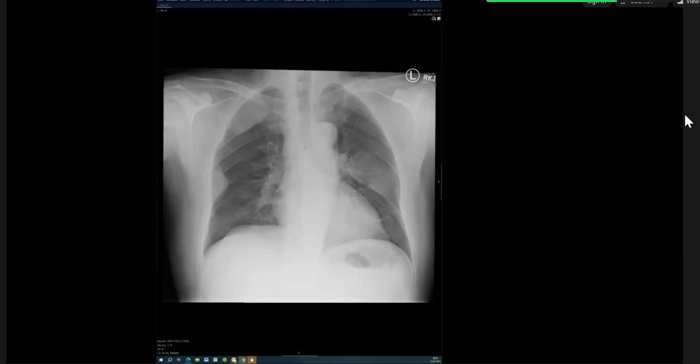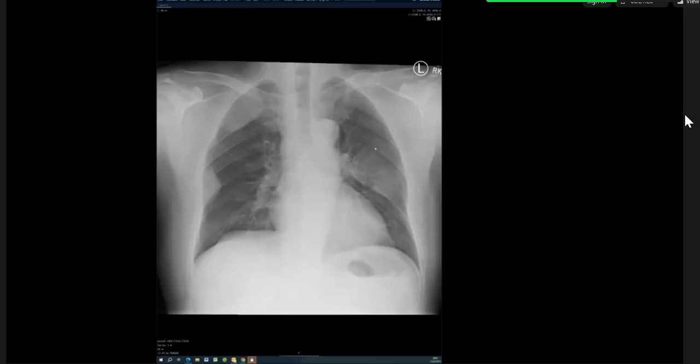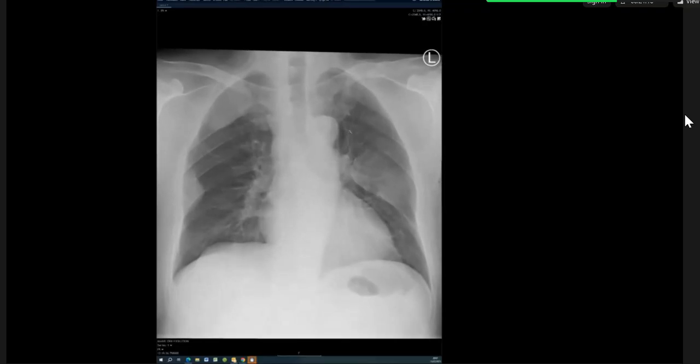Okay. So you mentioned, I'm guessing these two, and the one in the left mid zone. And there's a right paramediastinal one as well. Apologies as well, superior mediastinum, yeah. Okay. So you said no bone destruction. Do you want to think about that again and help me find the bone?